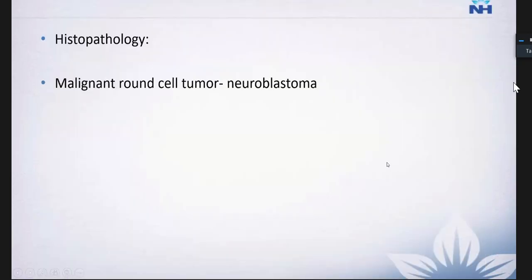Right. So not all extradural or epidural lesions are hemorrhage. You should be aware of the clues, whether they look more like masses or like some sort of hemorrhage, right? So here the take-home point is that not all hyperdensity is hemorrhage, right?